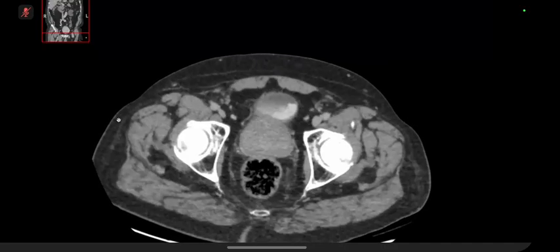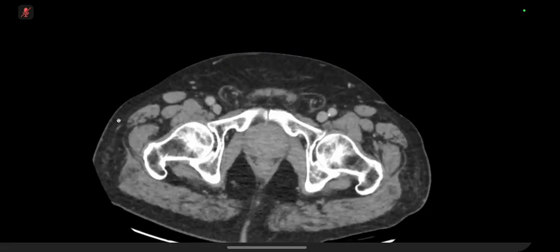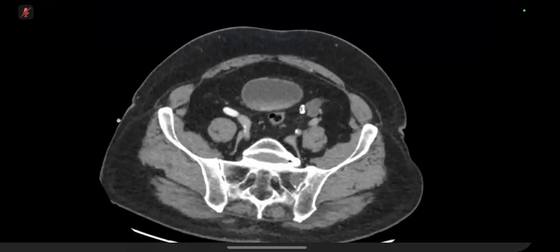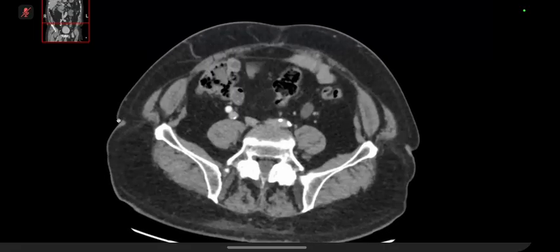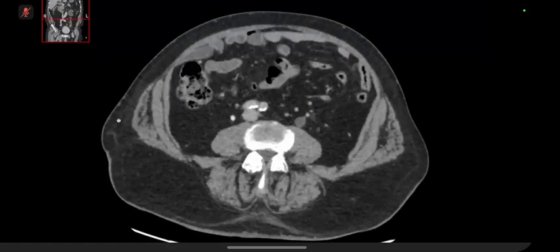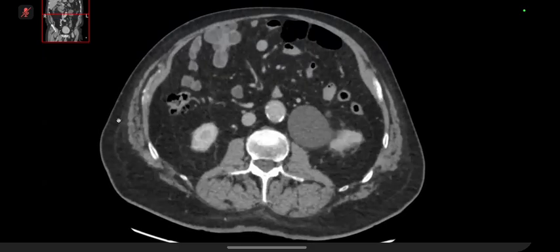I'd like to see up to the prostate. The prostate is enlarged and well defined, most likely a benign enlargement of prostate. So I think this is ureteral pseudodiverticulosis, with multiple outpouchings arising from the ureter.